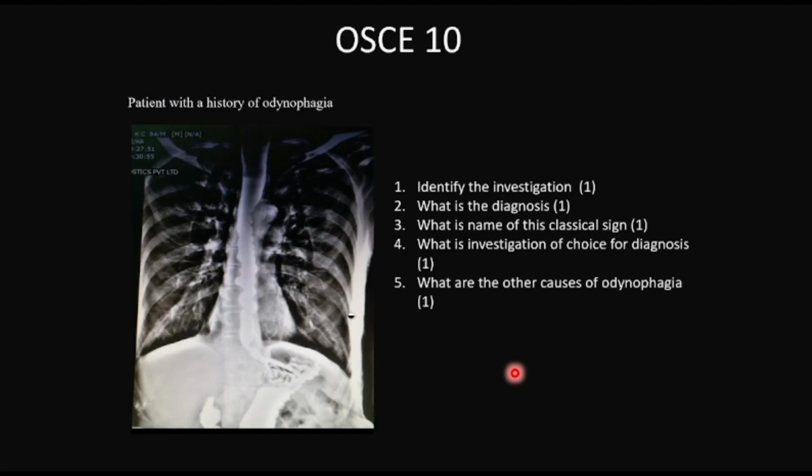This is our last OSCE. There's a patient with a history of odynophagia and this investigation is performed. Go through the image, identify the investigation, and identify the finding or pathology which is seen in this image.